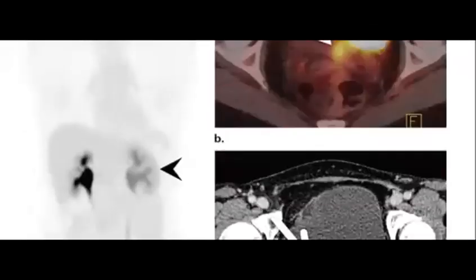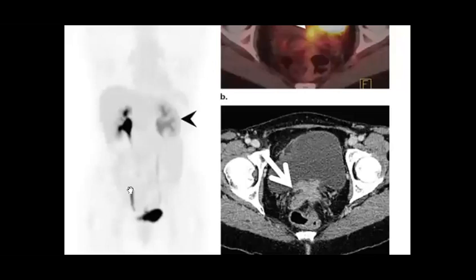So for example, here, if you go to the bladder and the CT, let's have a look at the bladder and CT. Yes, there is some different excretion between the right kidney and the left kidney, right? So probably the problem is here. Do you agree with me? Then when you look at the CT image, you will find this mass.